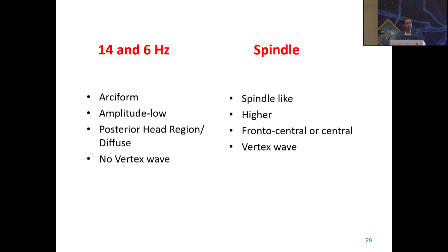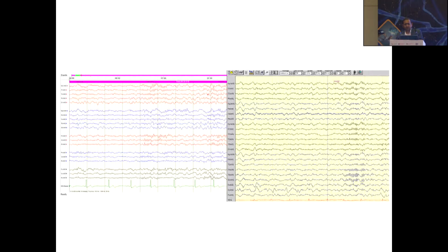Amplitude is low, more posterior. Here it is anterior. So one example, you can see these sleep spindles appearing anteriorly, while the 14 Hertz is appearing posteriorly.